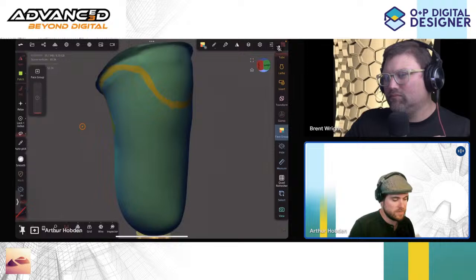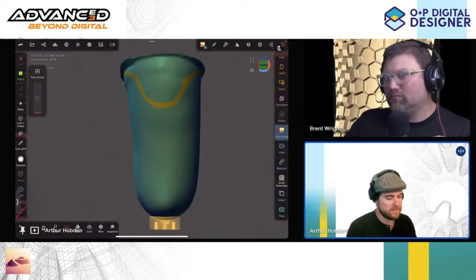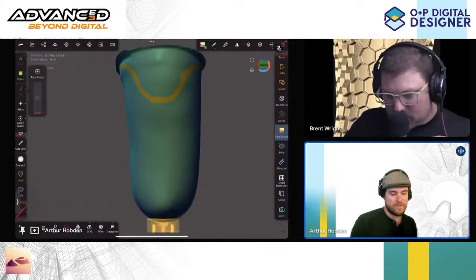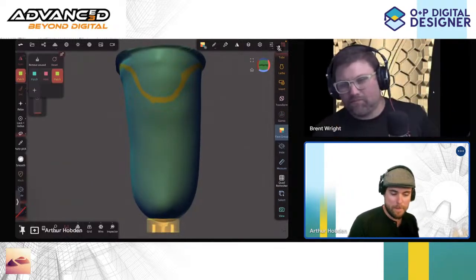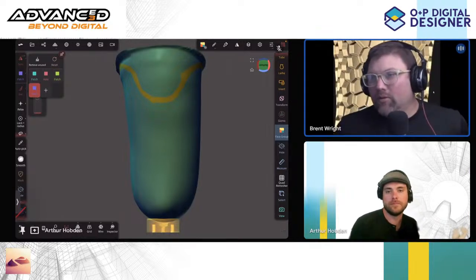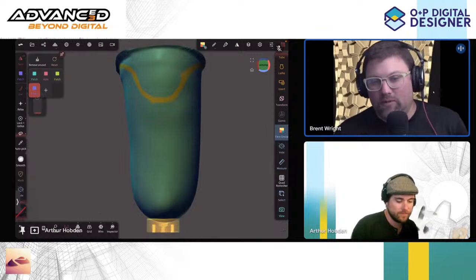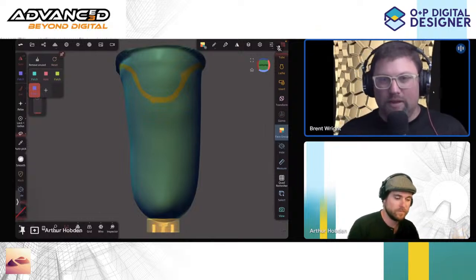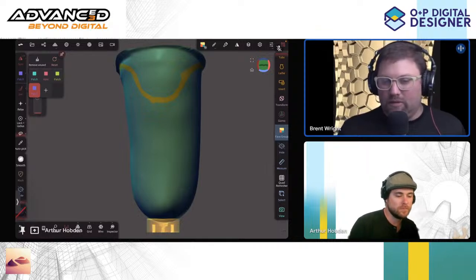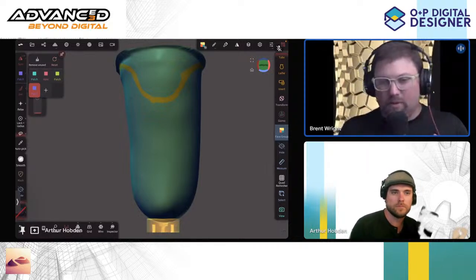And now we can talk about modifications. Zoning out our modifications. So everyone's got a different answer. I'm sure you have your own. I try and follow textbook stuff just to stay neutral, but do you have a particular style we want to do today? Well, it would be hard to do it with this model, but for my preference and the people that I know that have done it, it used to be called the RCR method, but now it's called the Stable Flex method from Coyote Design.